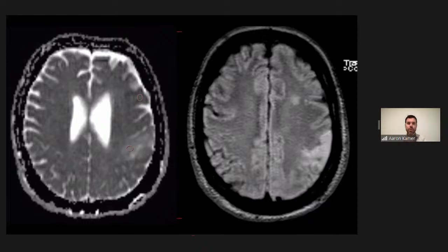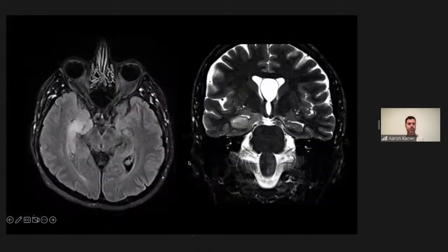So what would you expect? I'd expect low ADC. Yeah, and actually either one can be present in the setting of a recent seizure. You can have the seizure outstripping the blood supply's ability to provide oxygen to the cortex that's having seizures, especially in the setting of status epilepticus. So the patient is seizing, and they eventually have cytotoxic edema because the blood supply just can't keep up, or it may just be a reactive, more vasogenic style of edema that we see in these patients, especially if it's a little bit less impactful of a seizure. Nice. Okay. Thanks, Stephen.